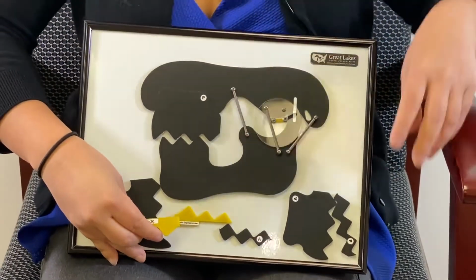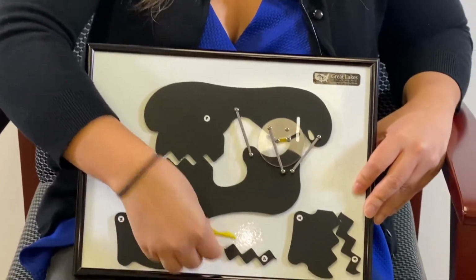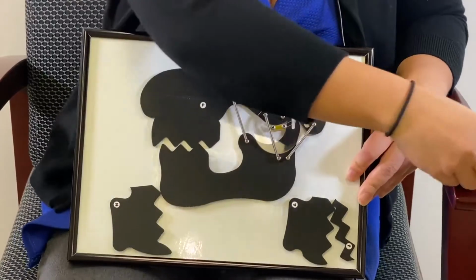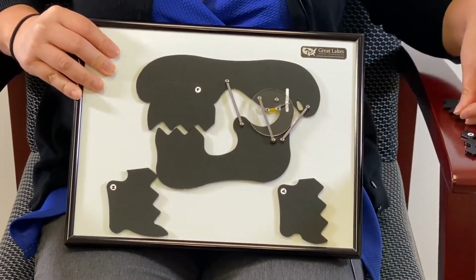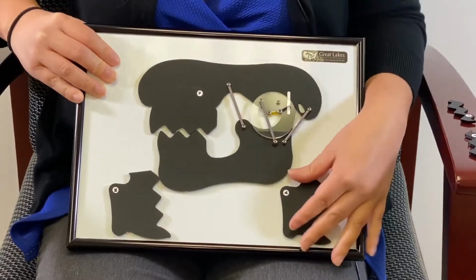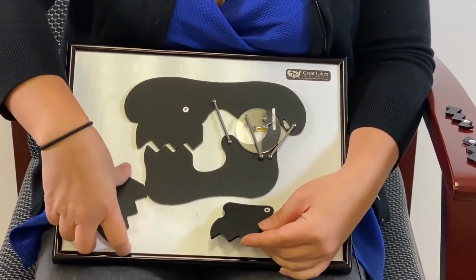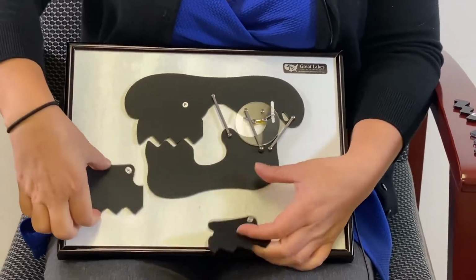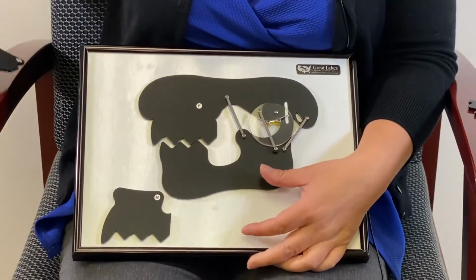It comes with these splint things that I'm going to put away, because we are not actually going to use them in the explanation of what's happening when a jaw joint is clicking. What we want to use is these three pieces. You've got the upper jawbone here with the upper teeth. It's A, N, and P. A is anterior, I'm going to put that aside.